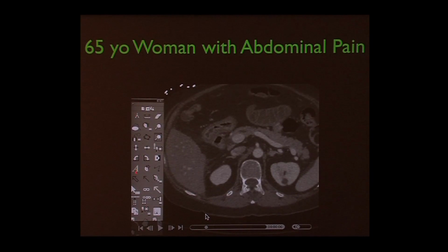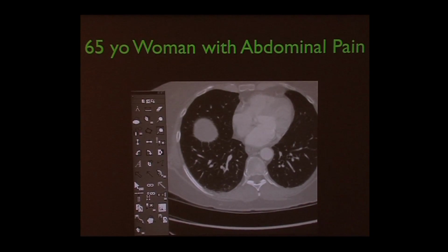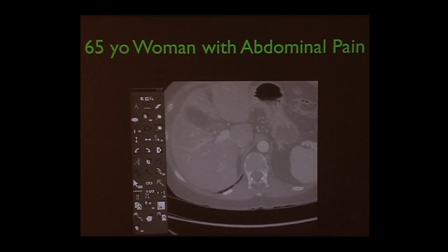And this is our toolbar. So, I mean, this is just a few of the tools. So yes, Sherlock had his magnifying lens, and that's what we had before computers. But we have all sorts of tools, and this is only partial, this is my user preference. I put these on this toolbar, but there are about 100 other ones I could put on there. These are the ones I use most. And I'll show you how we use them. We can change the window settings. So unlike, as I mentioned before with the film, where you could bright light a dark area, I can do whatever I want with these. It's all digital data, computer data.